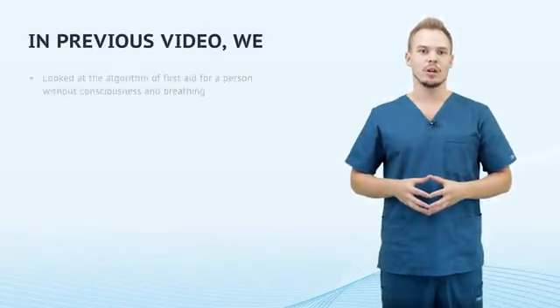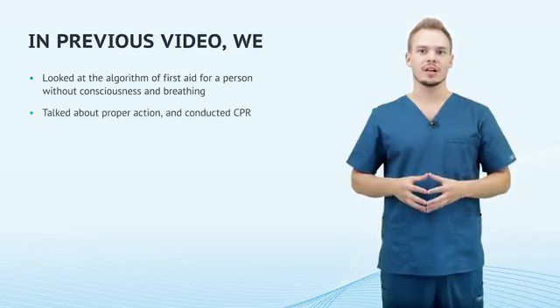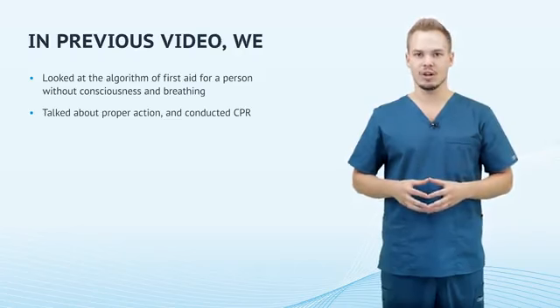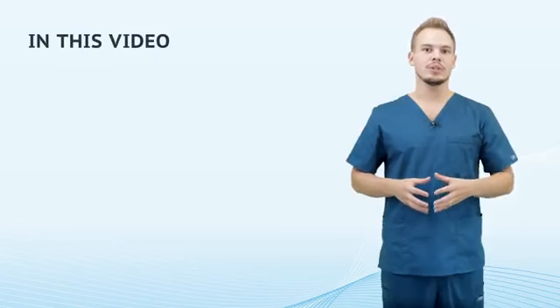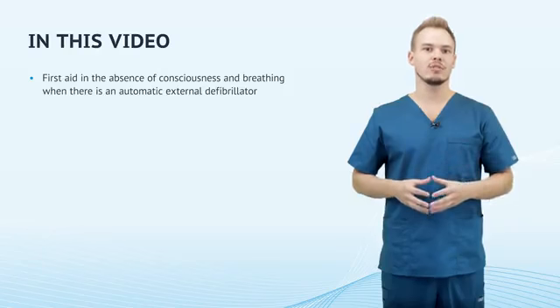Hello, dear listeners. In the previous video, we looked at the algorithm of first aid for a person without consciousness and breathing, talked about proper action, and conducted CPR to maintain vital functions of the body until the ambulance arrives. Today we will discuss how to provide first aid to the victim in the absence of consciousness and breathing when there is an automatic external defibrillator, and learn how to use it safely.